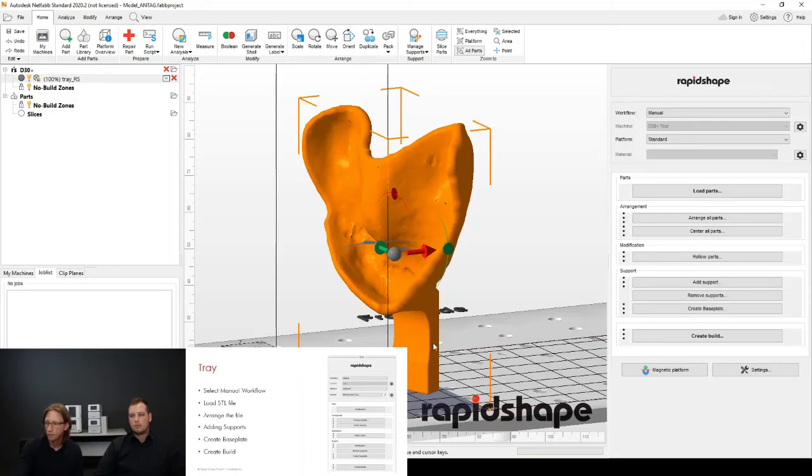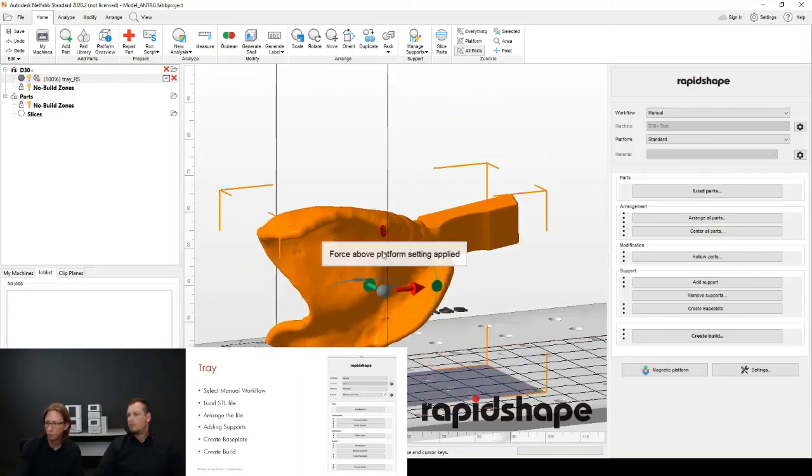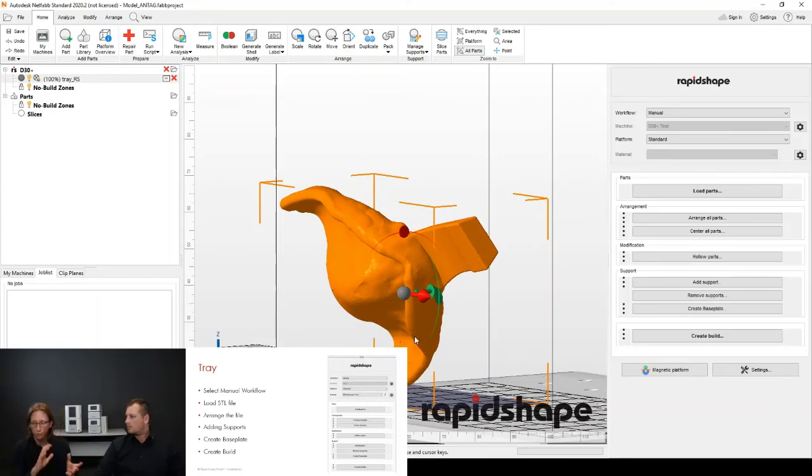So now this is already pretty much perfect, but let's assume you have a situation where it looks like that, really silly and super weird, and we just want to take it all the way back to the platform.